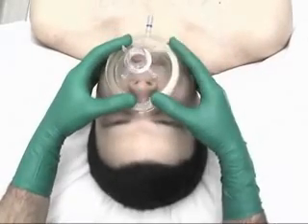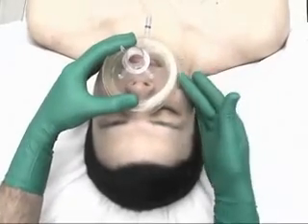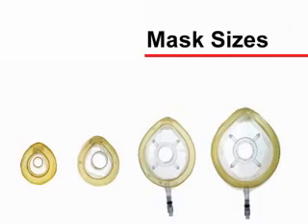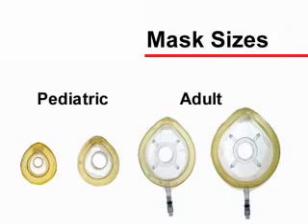To maintain a good seal, it is imperative for the mask size and shape to conform to the facial anatomy. This is particularly important in the pediatric population. Thus, several mask shapes and sizes should be readily available.